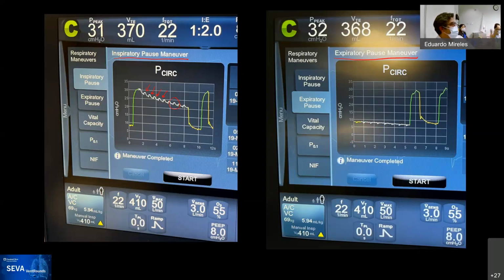Where do the cardiac oscillations come from? So what structure is right ahead of the bronchi, and the left atrium too, right? Right.